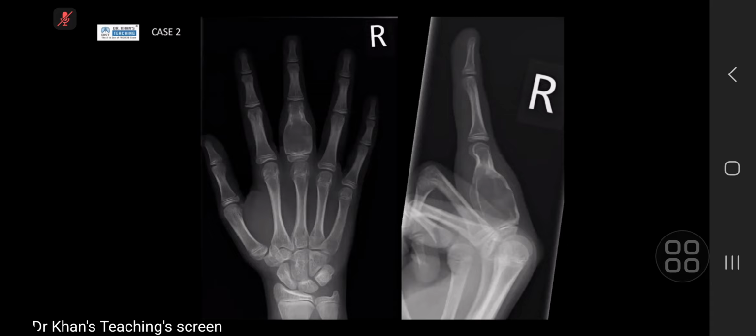And so, would you be saying this is aggressive, non-aggressive? Would you be suggesting anything else? So it is a lytic lesion, and since there's no periosteal reaction or soft tissue abnormality on this particular radiograph, I won't be able to comment. I would suggest cross-sectional imaging, particularly an MR of the lesion, to comment on it. You would suggest it? I'm really sorry, you keep cutting out. Yeah, a cross-sectional MR, to comment on its aggressiveness and further involvement of other structures.